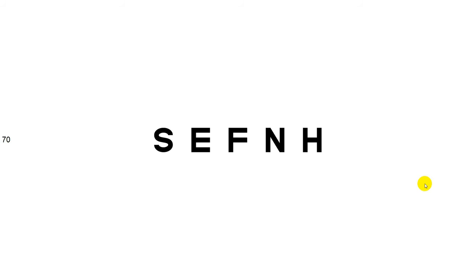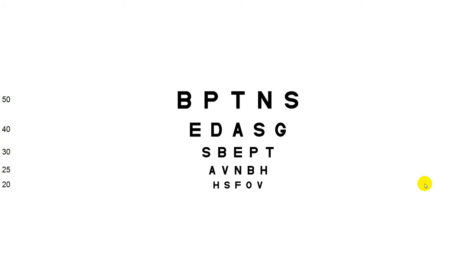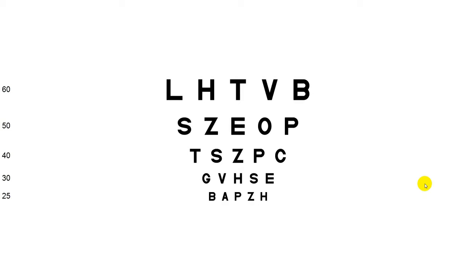The yellow ones are pretty self-explanatory. You want a 2080 line, click it, you'll get a 2080 line. If you're on this one, you'll get 80 and up. If you hit 20, you'll get 20 and up. So that's all the yellow ones. Instant access to those numbers from the lowest all the way to the highest in 5 lines on the screen.